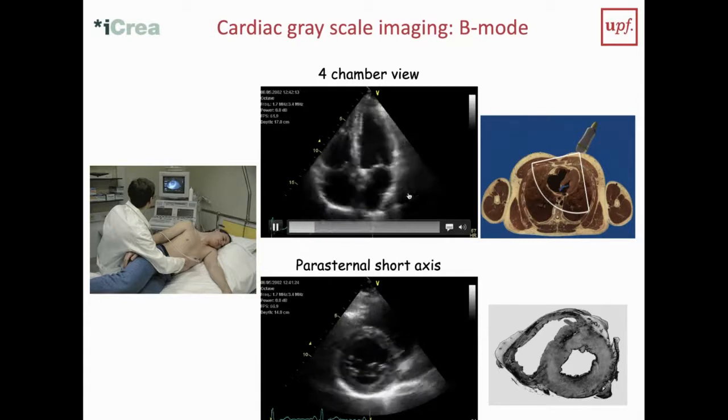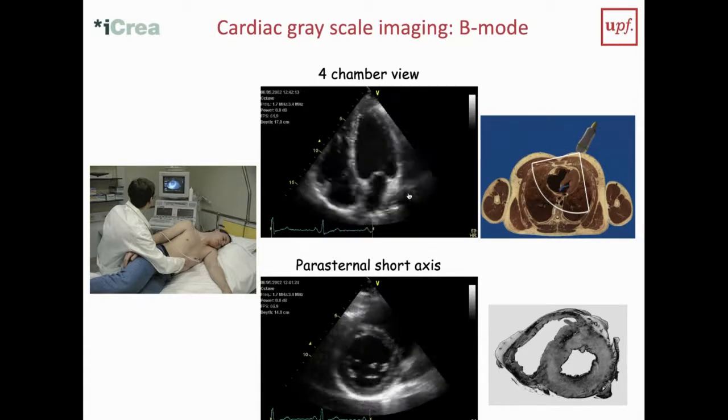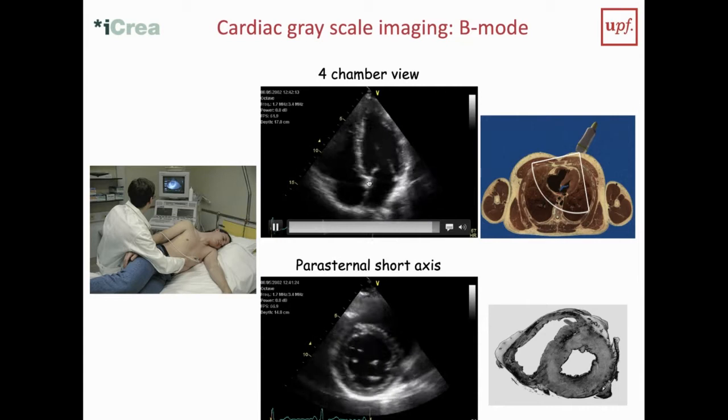One thing that you see now, if you look at the whole heart, is that clearly the outside border of the heart is not changing. So it's really inside that is moving. And a very important component of function is how the valve is being dragged towards the apex.